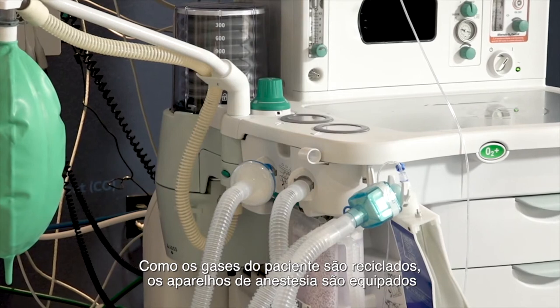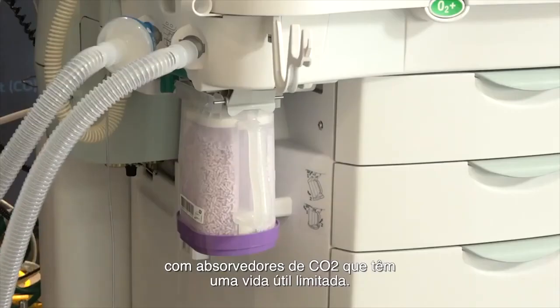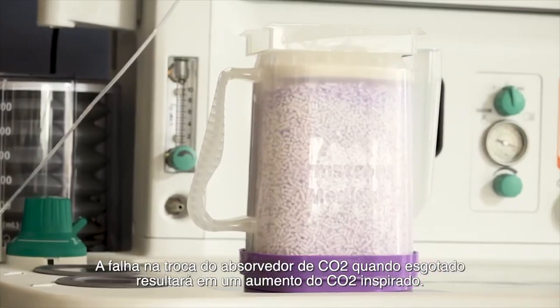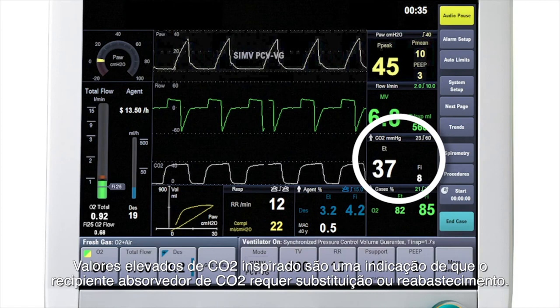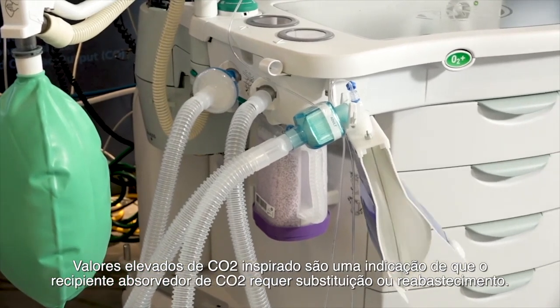Since patient gases are recycled, anesthesia devices are equipped with CO2 absorbers, which have a limited useful life. Failure to change the CO2 absorber when depleted will result in an increase in inspired CO2. Elevated inspired CO2 values are an indication that the CO2 absorber canister requires replacement or refilling. Monitor and replace patient circuit filters as necessary.